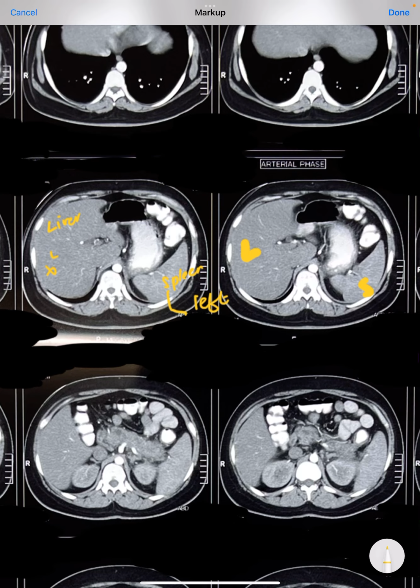We can always identify gut, intestine or stomach by two to three things. First is gas, because the gut always has some food, and after food is digested, gas is created. Apart from that, it can have some food or feces; it is not mandatory, but most of the time there is some food present in the gastrointestinal tract. So the presence of gas and food usually suggests the intestinal system. Here, this is all gas.